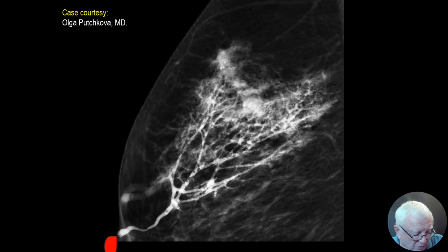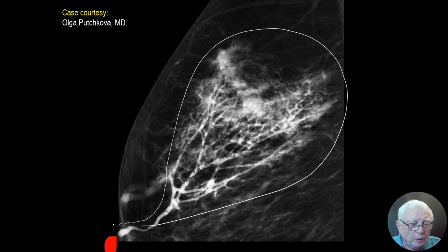Now I invite you for a little intellectual exercise. When the contrast-mediated galactography outlines a lobe, and it strikes you that women should not have so many ducts. Why is it too many?